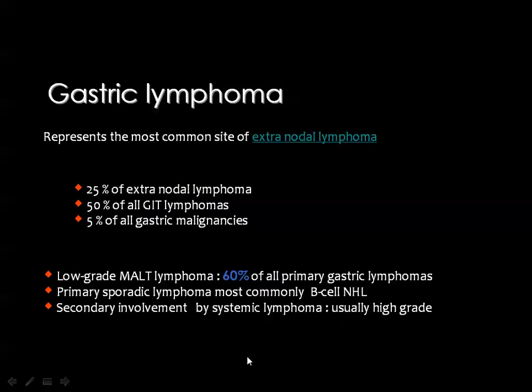And gastric lymphoma: the stomach is considered one of the common sites of extranodal lymphoma, and 25% of extranodal lymphoma may affect the stomach.